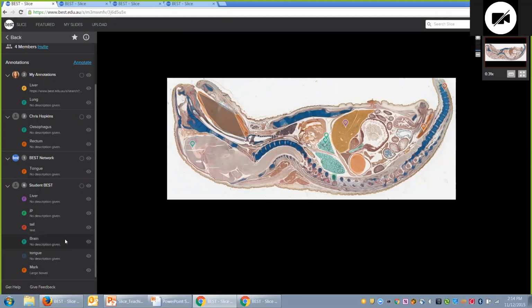So this particular way of setting up an activity we often use for small group activities where people probably know each other, they're working in small groups. Whereas more often for the anonymous accounts, we're using large classes where to encourage people to annotate, we keep them anonymous. Okay, so now we've had a look at the setting up of the tool. I'm just going to run through a couple of examples that we've had in classes.